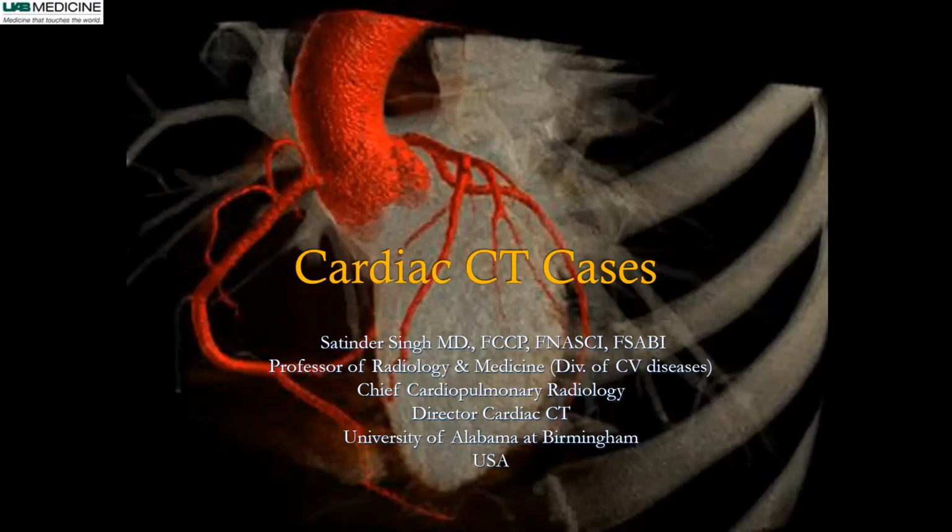For example, a calcium score of 0 has a very low cardiac morbidity and mortality over the following 10 years. It's usually in the order of 0.3%. However, when we have a very high cardiac calcium score, if it's greater than 1,000, for example, the cardiovascular morbidity and mortality is as high as 8%, which is pretty much similar to what was found in the Fourier study, which was a secondary prevention trial of evolocumab or Repatha in patients that have coronary artery disease.